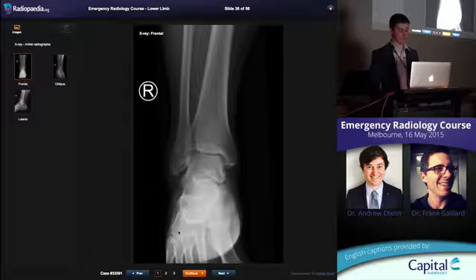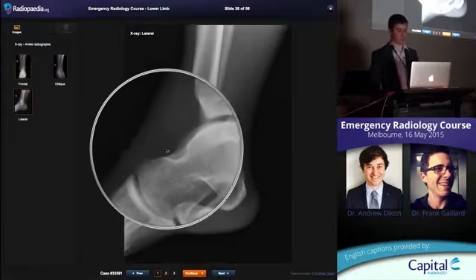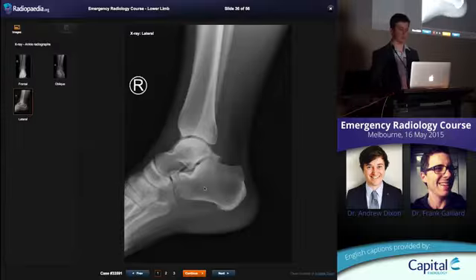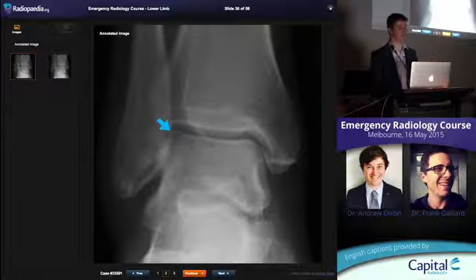Everything else in this ankle looks pretty normal. They may have a bit of an ankle joint effusion. You can see that the fat is a bit effaced out the front here. We'll describe that again in a moment. There's an arrow on that little bone fragment. So lateral corner of the talar dome, very important injury to recognise. Any talar dome injury, important to recognise.